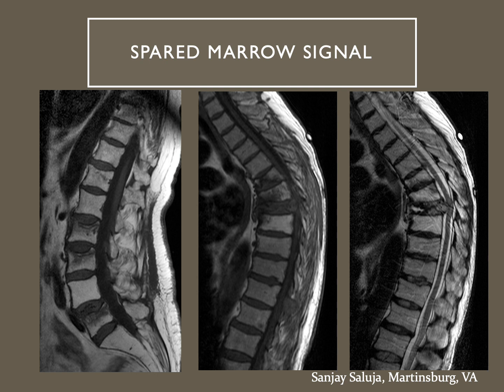If we look at the fracture at the two vertebral bodies above the malignant collapse, you will see that they have got some buckling of bone, they have got some fracture lines, but there is maintained fatty signal. So therefore, it is one vertebral body with malignant collapse, and the two adjacent vertebral bodies actually have osteoporotic fractures, which is almost like the domino effect.